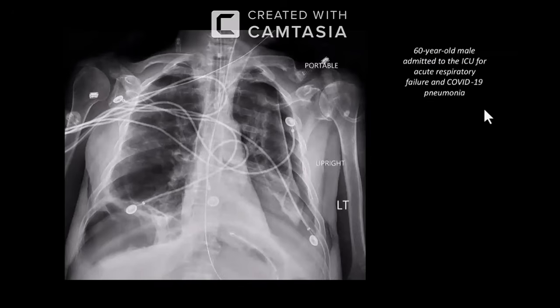And okay, I can see in the lungs... Okay, I just want to comment on one more line I just noted before proceeding to the lung findings. I suspect that there is a central venous line noted as well, with its tip in the atriocaval junction. I think that this is coming from the left side. Probably there is a left-sided superior vena cava, with its tip lying correctly at the atriocaval junction.